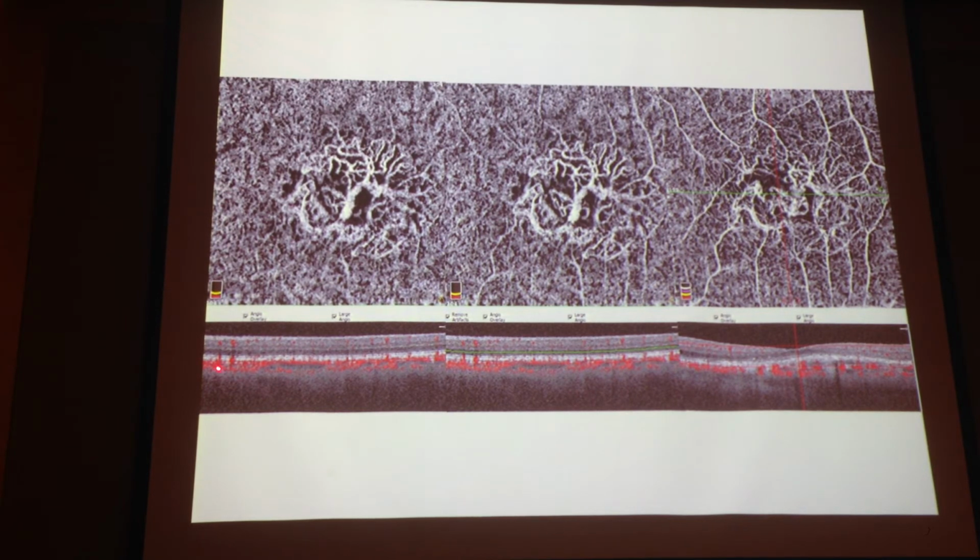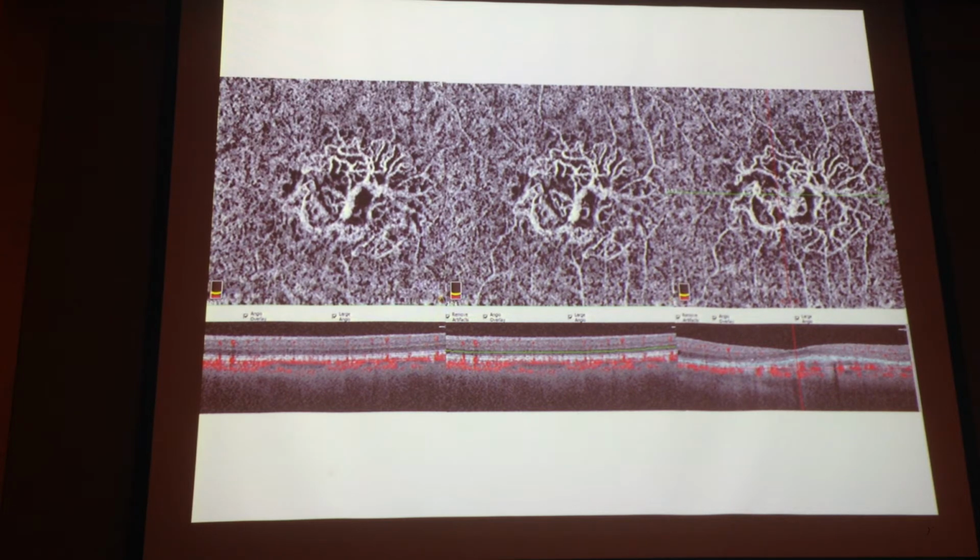But you see that the segmentation was always starting at the same point, but was changing just the thickness of the slab. And of course, if you also change the type of the segmentation, you can get also a different image of the same lesion.